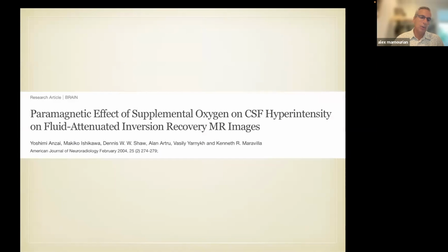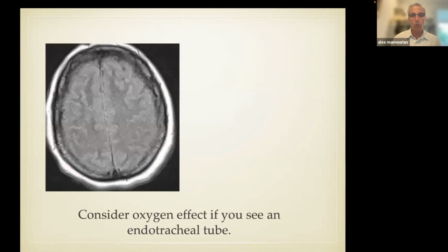If you want to read about it, there are a number of papers about the paramagnetic effect of supplemental oxygen. If you go back to the literature, I'm not sure what you were taught, but this was actually attributed to the anesthetic agents. I can tell you this is not simply due to the anesthetic agent, it's simply due to the oxygen itself. So you don't need anesthesia as well.